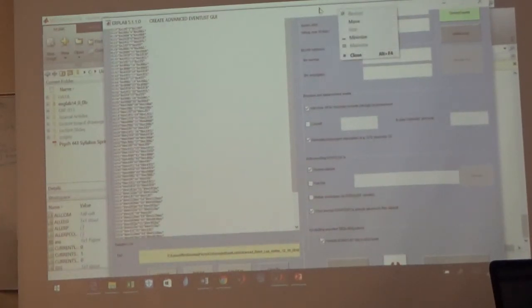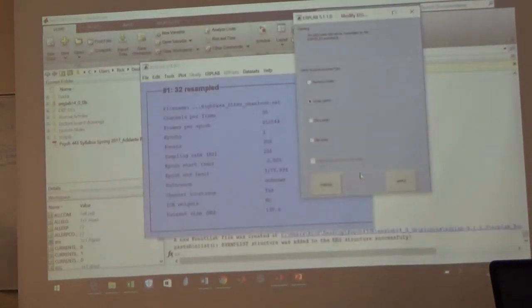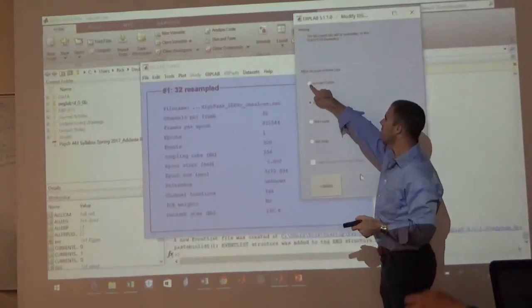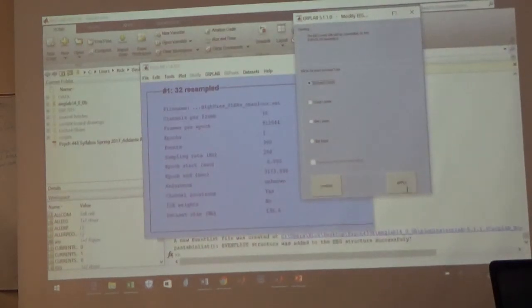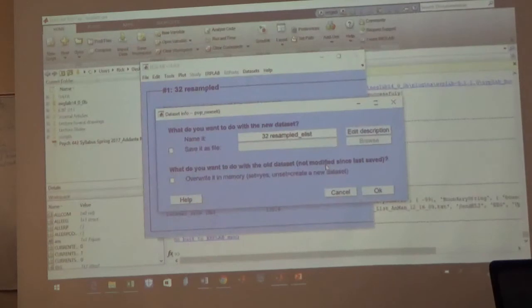Alright, so all you got to do is basically hit apply on the bottom right hand side, and it should run. Now it's going to ask you, how do you want to keep your event types? Let's bump it up to numeric codes. So you just hit that number there that says numeric. Okay? Then hit apply. Now, is everybody here? Did that work? Did it not work for anyone?